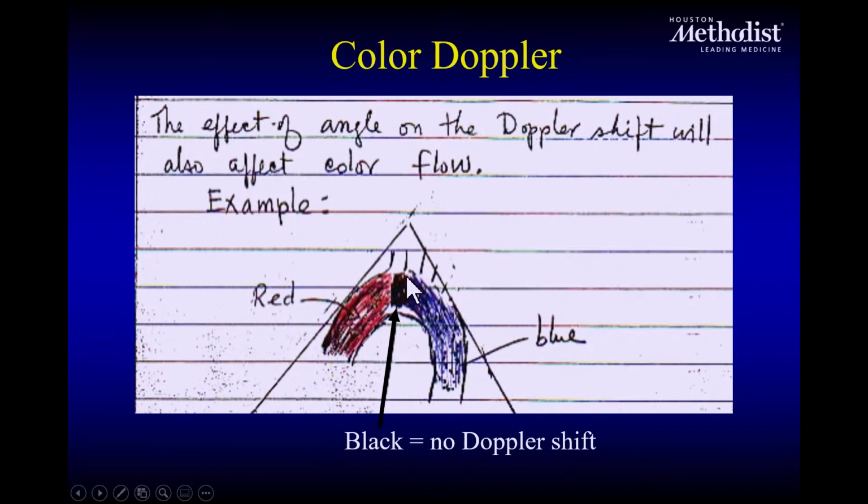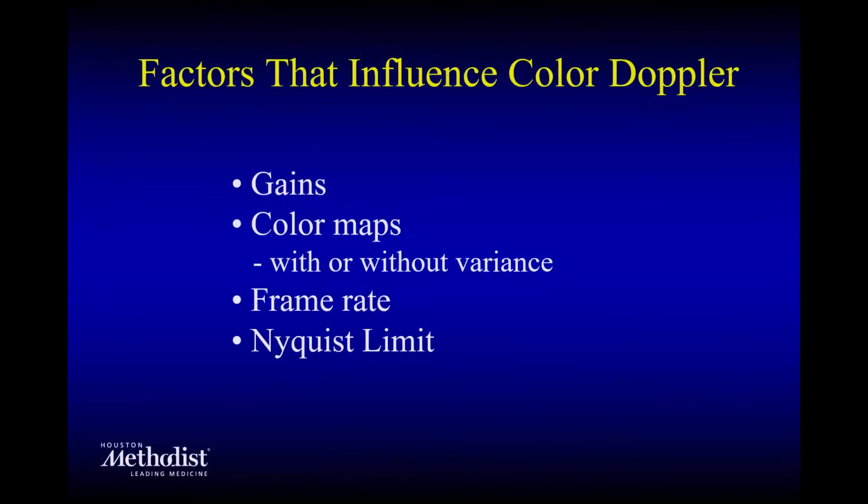Now, if you change direction, right, so color coding is red or yellow coming towards you, bluish hues going away from you. It took some time for people to accommodate and agree on these back in the late 70s, early 80s. But if you change direction, remember this is perpendicular to flow, the ultrasound. So it's a blackness. There's a black area because not the velocity is 0, but you're at an angle of close to 90. So whenever you see a period of blackness, you've changed the direction.